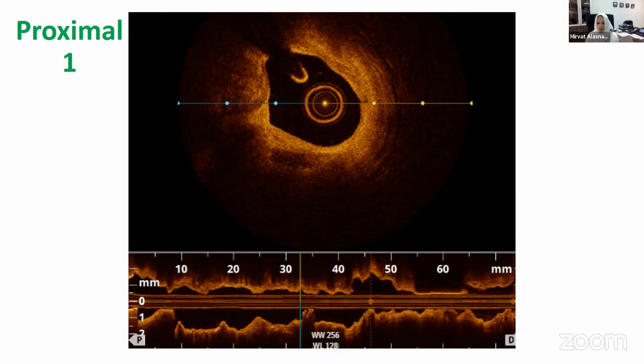So nodules are very tricky because there are actually two types of nodules. One is the nodule that I just showed you, which is a very stable nodule and is probably going to present as a chronic coronary syndrome. And then there's the eruptive nodule. I'm going to show you an example in just a moment of what an eruptive nodule looks like. That's usually a more active process happening in that lesion. So there are fractures that have happened, hematoma into the wall of the vessel and into the wall of the nodule, and then it just continues to expand and potentially can eventually thrombose the whole vessel.